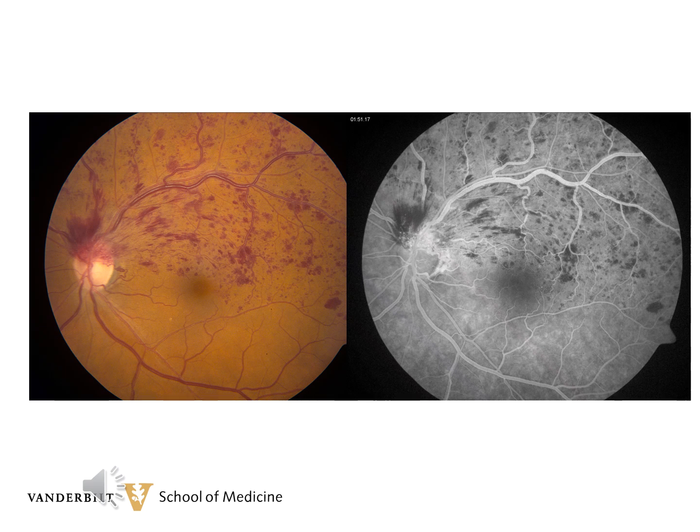Here's another example of intraretinal hemorrhaging, and it shows some interesting features. This patient has a hemi-central retinal vein occlusion. You can see some very superficial retinal hemorrhages just superior to the nerve, and these hemorrhages block the fluorescence from the major retinal arteries and veins just superior to the nerve. More peripherally, the hemorrhages are deeper in the retina, and you can see the fluorescein in the retinal vessels overlying the retinal hemorrhages, but the retinal hemorrhages are blocking the choroidal fluorescence.